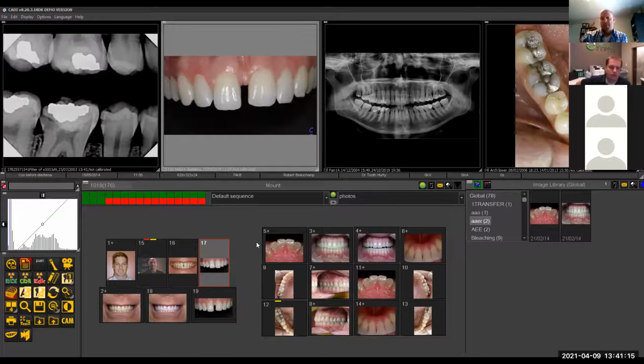If you have the computer crash before you hit that save button, is it already on the server, or is it kind of just living on the computer at that moment? It's in a temp file. When you acquire the images in the acquisition mode, it's going to be held in a temp file. And when we hit that save all, it associates the images to that one patient. So there is a way to recoup and find the images. If everything does crash, they should be in the temp file.